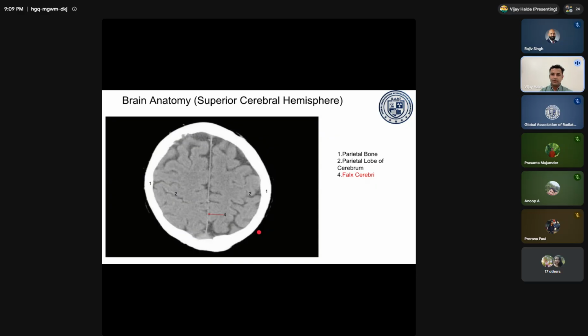So this is the first slice of the brain CT. The brain is one of the most complex structures in radiotherapy. So understanding the brain anatomy will help in whole brain radiotherapy, stereotactic radiotherapy, and stereotactic radiosurgery also, where a high dose is delivered while avoiding dose to the nearby critical structures. So today we will identify the cerebral lobes, ventricles, cerebellum, brainstem, skull-base structures, and other important intracranial organs.